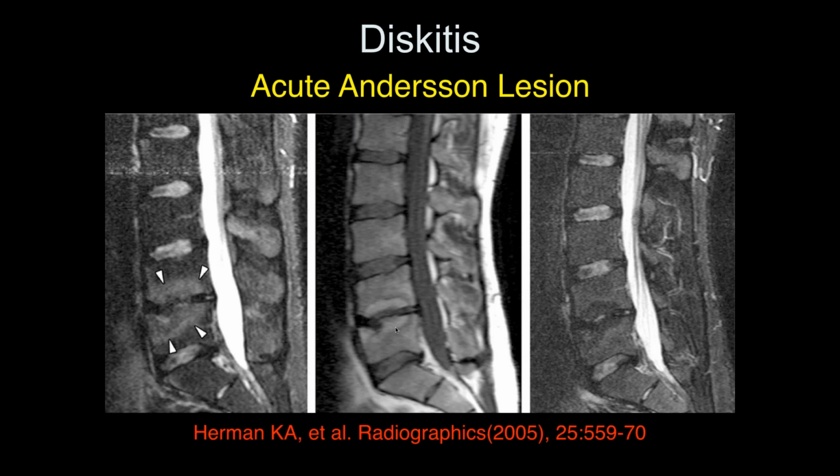That's all the same patient. These are all different patients. All different. Oh, this is all the same patient. Yeah, these are just different techniques. Okay. Oh, I guess it's the STIR. This is probably a T1 fat-sat. This is a STIR, and this is a T1.